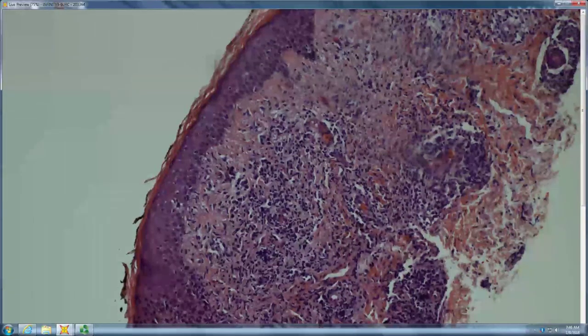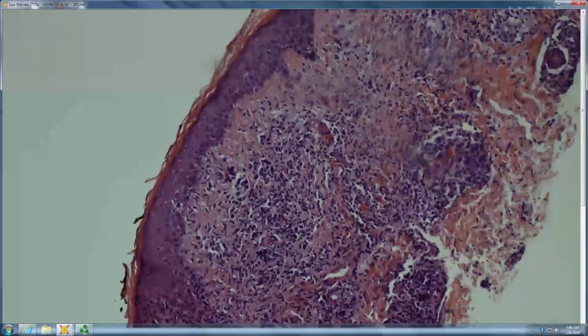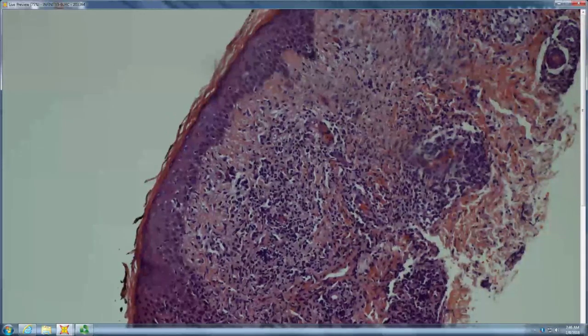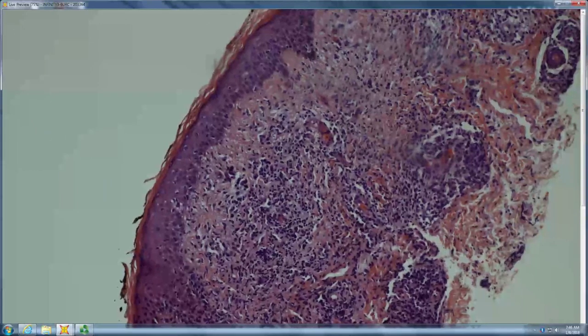This might be another granulomatous type. So it could be granulomatous again. You have an interstitial, sort of busy dermis down here. You have a little bit of interface, especially on the follicle. You got a little bit of spongiosis there. You even have some plasma cells in this one, and this is syphilis again. So you have to keep a high index of suspicion.